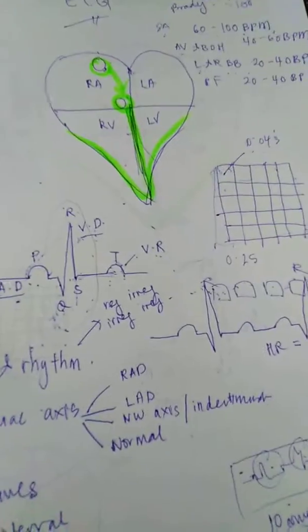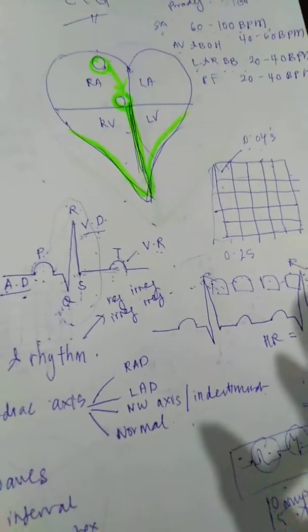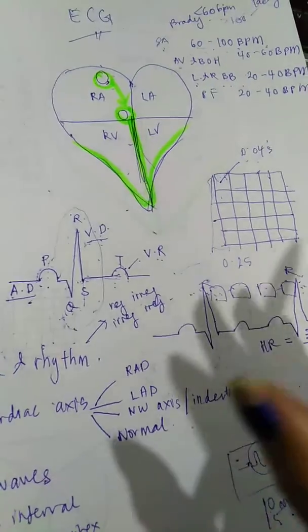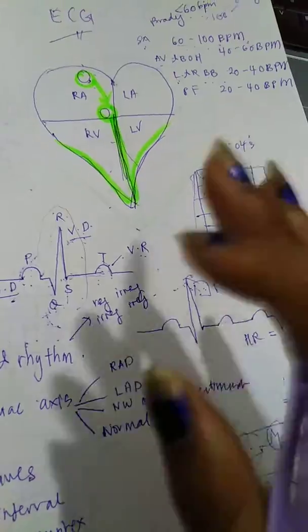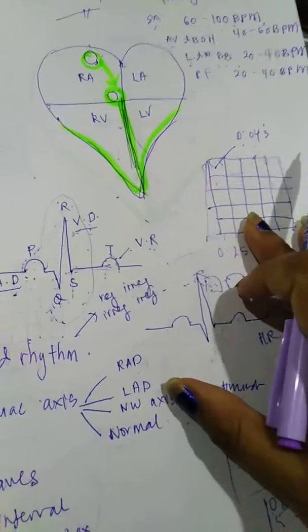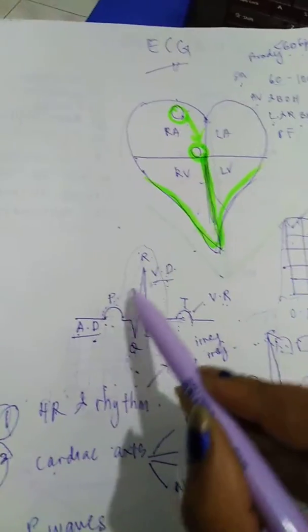And again, a small hint: if you suspect that there is some AV block, because as you know in your AV block the PR interval might not be constant. Some of them will be prolonged, some will be constant, some will be totally distorted, running on its own. Your atrium starts pumping on its own, your ventricle starts contracting on its own. So you need to mark your P waves and your R waves, which means you look at your atrial waves and your ventricle waves, and then check the PR interval along the strip.